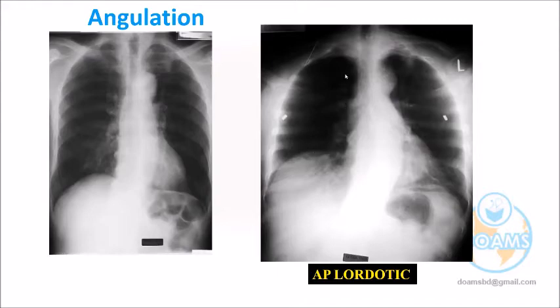And you see, this is the apical area. What is the difference between this apical area and this apical area? Dr. Hind, can you get any idea here? Right inspiration, left expiration? No, no. Maybe both are at the end of inspiration, but identify the clavicle.